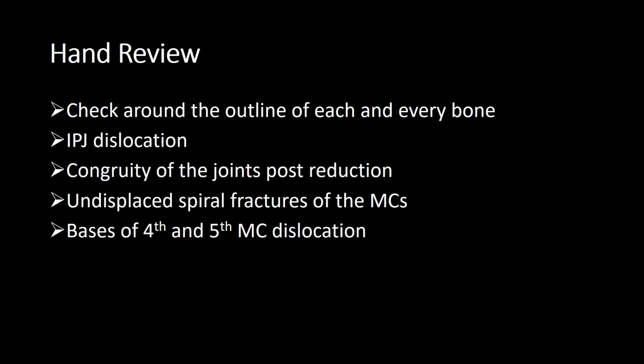So we've come to the end of the hand presentation. So what I want you to make sure that you review for every hand x-ray is to check around the outline of each and every bone. You must do that, that's really important, otherwise you will miss fractures.